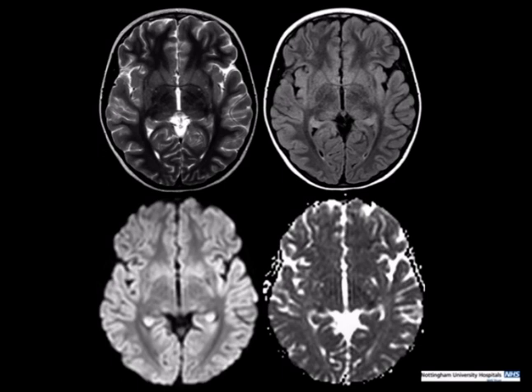And if you just look at the back end of the hippocampus on the T2, on the FLAIR, and also the diffusion-weighted imaging, there's high signal here with low signal on the ADC. So there's bilateral hippocampal diffusion restriction. And this is a reactive change secondary to hyperexcitability within the cells in the hippocampus, and is reversible without the type of gliosis or volume loss you might expect with ischemia. It tends to be fairly isolated to the temporal lobe structures.